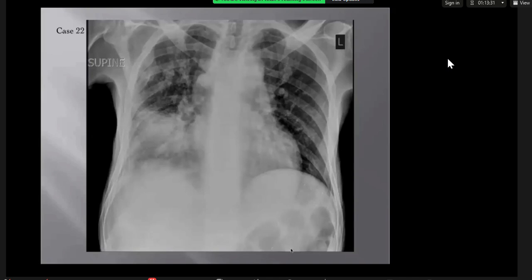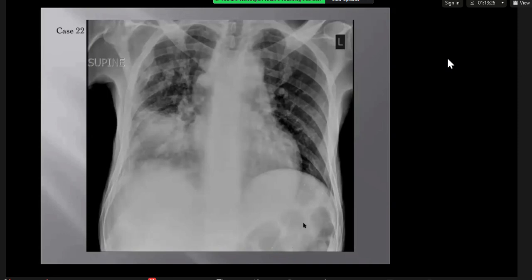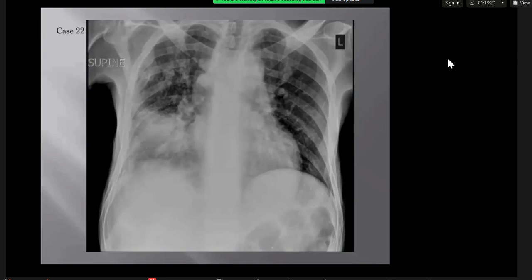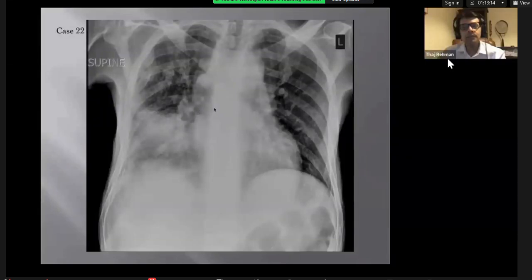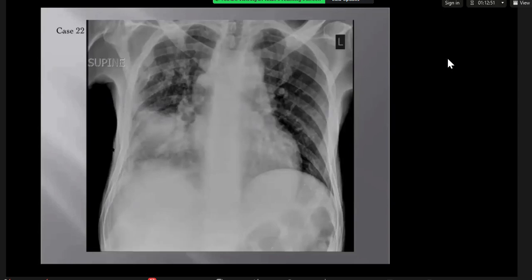Very good. It's a stent from where? I think it's probably the esophagus. Very good. So what has happened? The esophagus is not usually here. I think it's a descended or migrated stent. Yes, migrated stent. So this is a cancer of the esophagus. The stent has migrated, and when a stent migrates, patients don't know that. They're happily consuming their normal food, enjoying their breakfast, lunch and dinner, in a state of migrated stent with cancer, and all the food they eat goes to the lung and results in pneumonia, aspiration pneumonia.